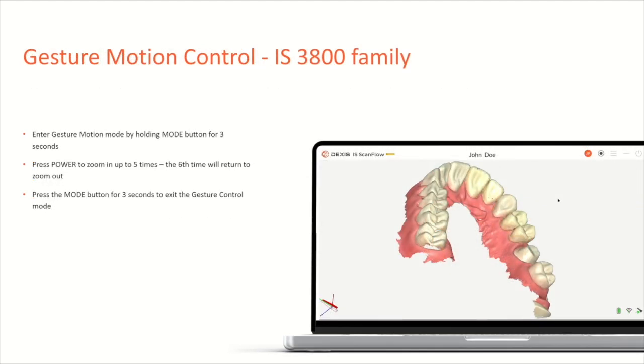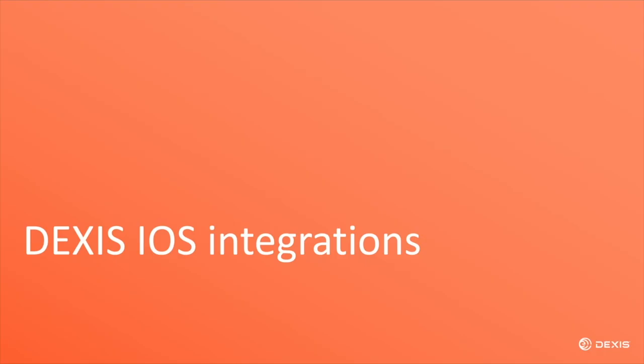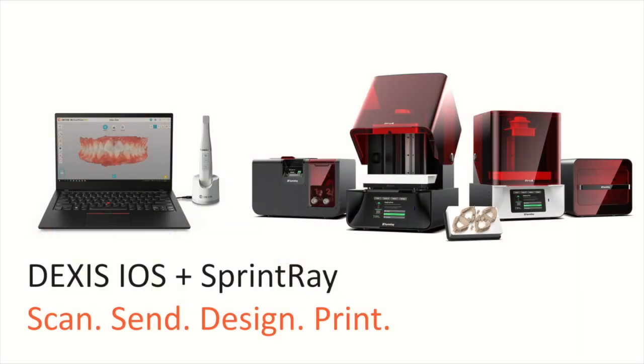And in the IS 3800 scanner family, there is an option to move the scan without touching the mouse or computer, just by manipulating the scanner in your hand. Actually, it's a very nice option when you are close to the patient and have gloves on your hands. And now a bit about integration. We can integrate with SprintRay Cloud Design, and basically if you have a printer on site, you can print, for example, a model just immediately after you made the scan.